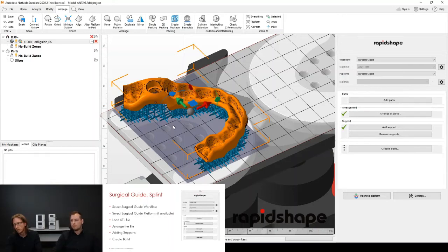So this is all you need to know about this workflow, but I think the question will come up. Antonio was asking about the ability to create your own support scripts, or when you want to only use certain support scripts.